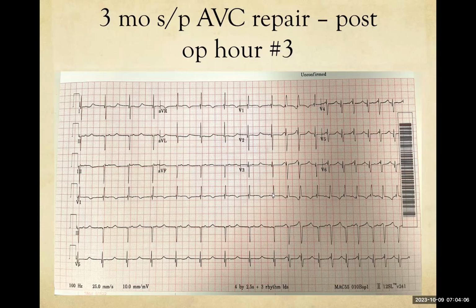Yep. And then you see that the QRS widens a little bit, and then appears to pick up. Again, doesn't appear to be, to me, concerning that it's not sinus, but then also seeing a widening of the QRS as well. And a little irregular in the rate too. Mm-hmm. What do you make of the relationship of the P waves and the QRSs, and particularly in these beats here? I don't think they're related. They're a dissociation, I think. There's dissociation, right? So what do you think this is, and what do you think this is?